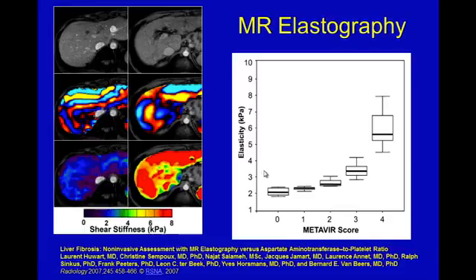So just to show you the correlation here, here's an MR elastogram. This is normal on the left, abnormal on the right. Here you can see it's a cirrhotic liver with some nodule formation. And notice here that when you vibrate the liver, you get these waves that are going through, and you can see them in their different colors here. You get different wavelengths produced by the vibration depending on the stiffness of the liver. And you can see here the wavelength is different, it's broader.